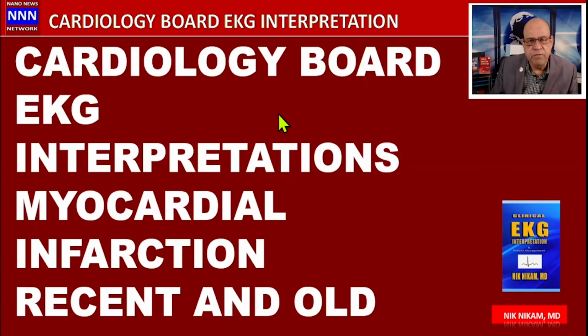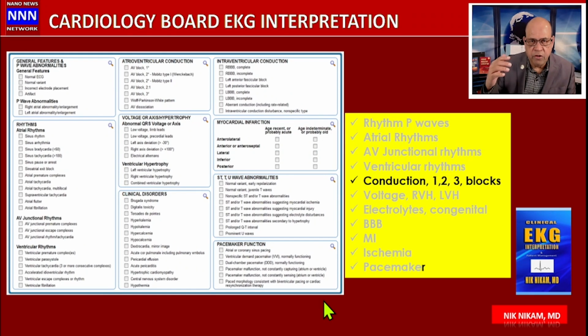So let us begin with the feature presentation, that is Cardiology Board EKG Interpretations, and the section is going to be on myocardial infarction, recent and old. For those who are taking cardiology boards, you may be familiar with the answer key that is provided to you to mark the EKG changes that you notice in the EKG section of the cardiology boards.